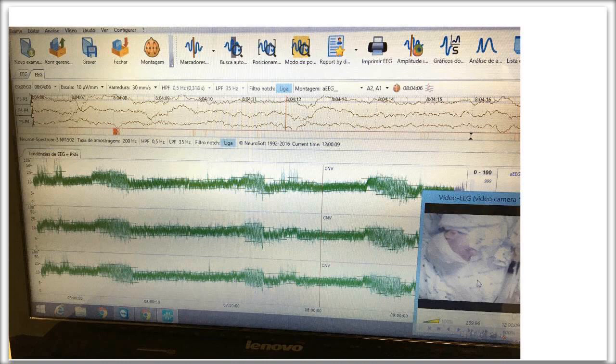Of note as well is that Gabriel uses a frontal parietal configuration for his monitoring. Originally I had asked whether the distance between these leads might have caused this increase, because it was a higher than normal trace, which we sometimes see if the electrodes are really wide. But then he followed up and sent me this additional tracing where the top of the aEEG is actually the P3, P4, and you can see that they're all quite similar.